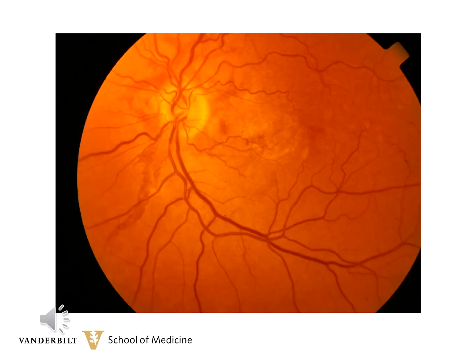This patient did receive photodynamic therapy because she came to my office before the era of anti-VEGF treatment. This photograph was taken 1 year after the photodynamic therapy. Again, you can see the angioid streaks quite well, and in the macula, she's beginning to develop some atrophy. Her vision had dropped a bit from 20/20 to 20/40, but over that year between the photodynamic therapy and this photograph, she'd had no further medical intervention of any kind.